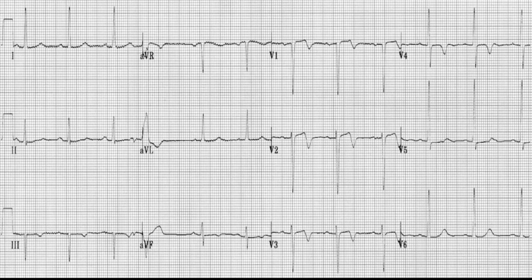Yes, what you see here again is V1, V2, V3, and V4. Here you see a biphasic T wave, and you will correlate it with the signs and symptoms. So the patient should have a recent history of angina. The patient may have normal or slightly elevated biomarkers. The patient's ECG may be normal or show not more than 1 mm ST segment elevation. If this criteria is there, you will directly send the patient for angiography, right? Very good.